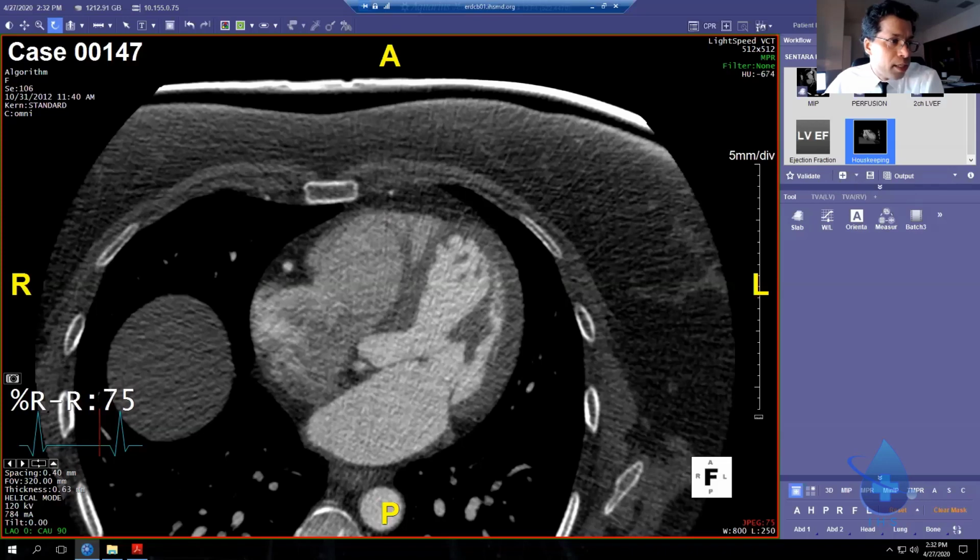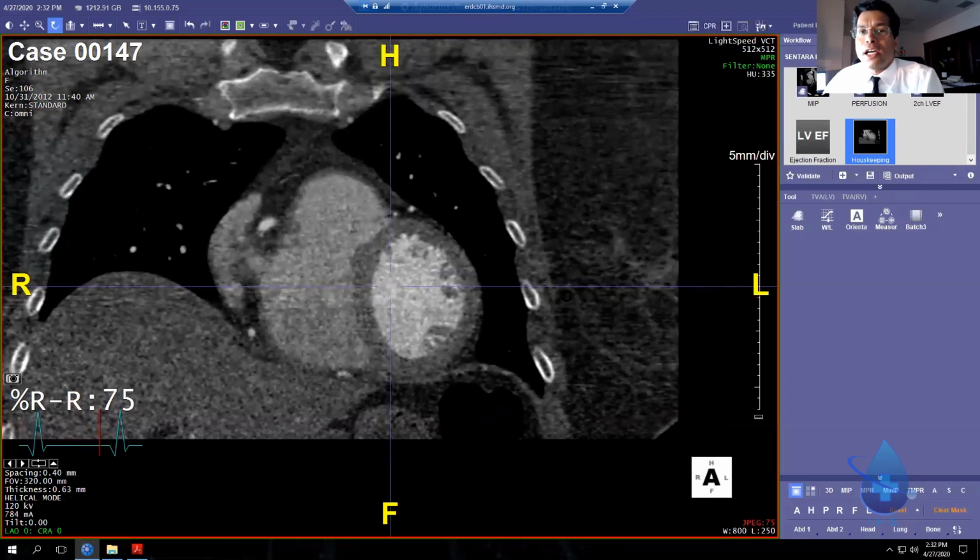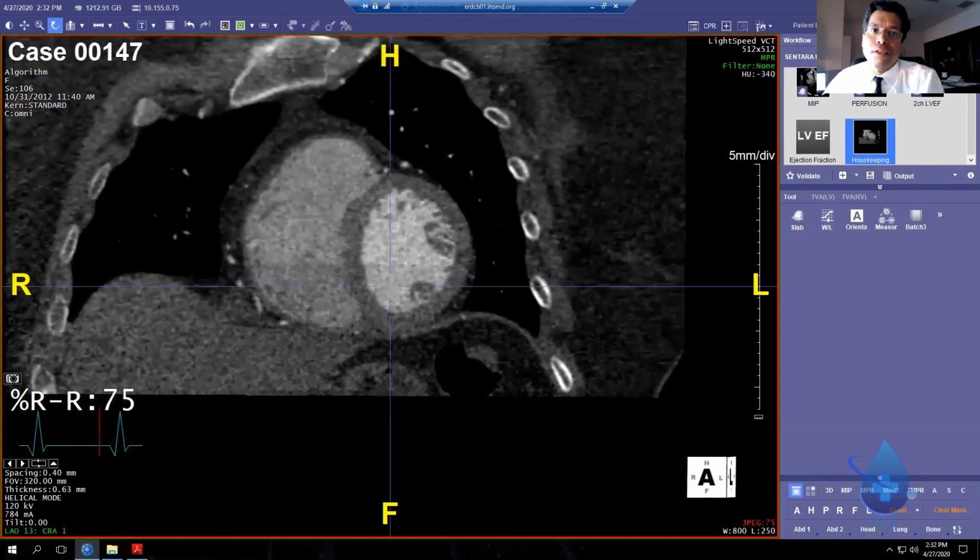The next one is resting perfusion. On our IHS website, Chris shows a case of COVID myocarditis with delayed enhancement. And later on today, I'm going to show you some cases of perfusion abnormalities that help you determine a chronic total occlusion, but it looks like a black hole in the myocardium right here. We're going to do that later on today. That's it. Now we're done with this lady.